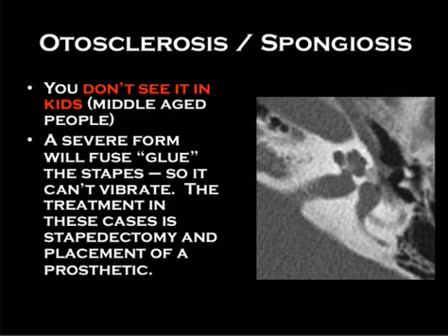In the really severe cases, the stapes will actually get fused, and that, I guess you could say, is sclerotic, otosclerotic. And those people are screwed because one of the treatments is to replace the stapes with a prosthetic, which can be more difficult.